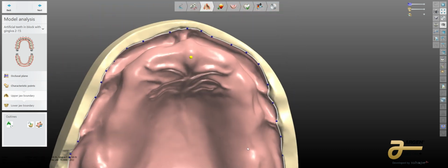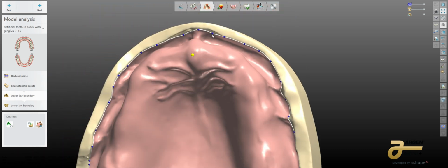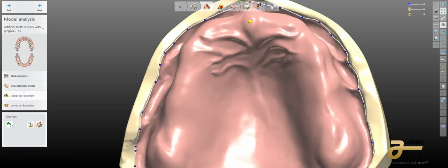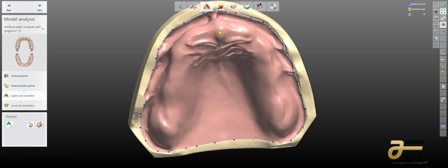This is a rather nice impression. This is ideal in a lot of ways. It gives us a lot of really good landmarks to be able to learn from. If you're just on your journey doing dentures, to learn how to do dentures, there's a lot of things that go involved to make the best quality dentures as far as stability is concerned, and that always starts with our foundation or our canvas. So we don't have to get too perfect on this, but I'm going to go ahead and just do what I normally do here.